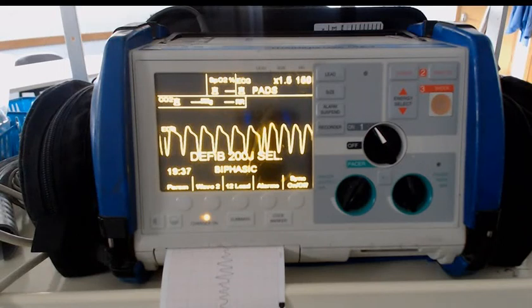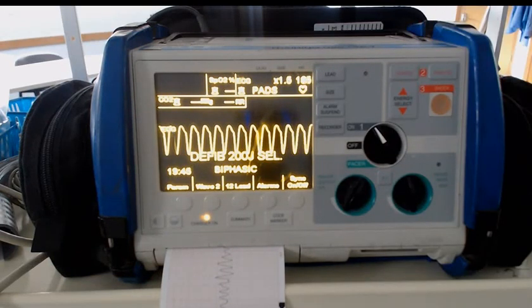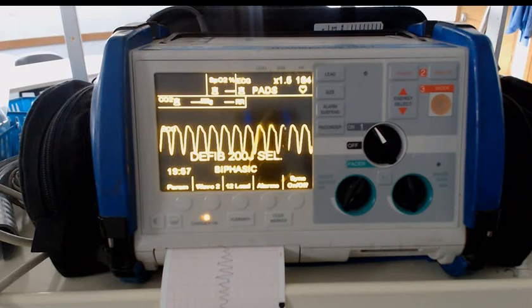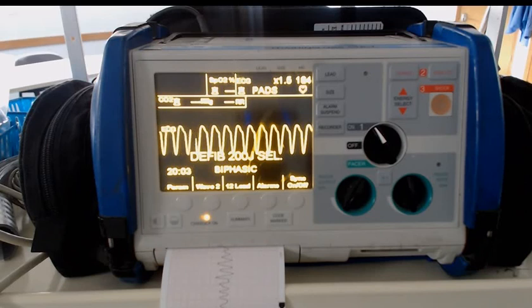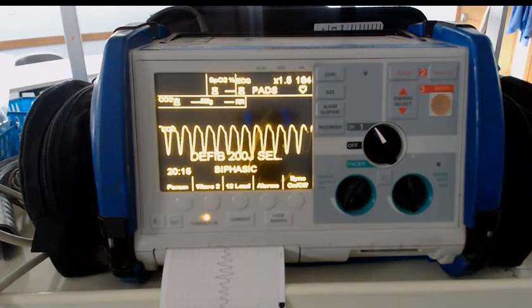You may also see a V-Tach that's quite a bit faster. This is a V-Tach in the area of about 184 to 185 beats per minute. A V-Tach at this speed is unlikely to have a pulse, but you still want to check the patient. If you find a pulse, again, you would want to either get a paramedic on scene quickly or go directly to the hospital, but you would not shock this rhythm if they have a pulse. If they are pulseless, again, you would begin CPR, charge the monitor, and discharge with the same recommendation for joules. Start at 120, then at 150, and then at 200. And hopefully at the end, you get back to a normal sinus rhythm.